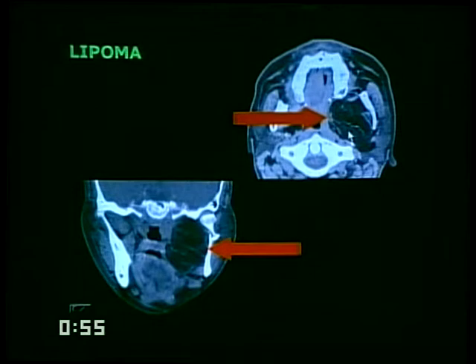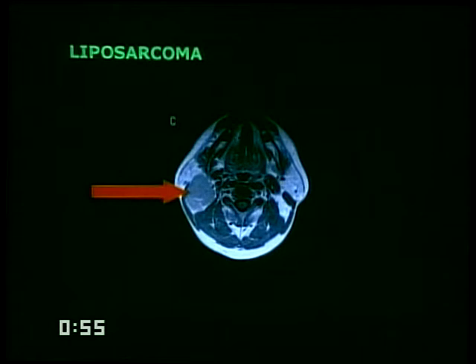This is a lipoma, fairly well defined, quite a rare tumor, but you do see lipomas in this location. Usually asymptomatic, but can be a palpable finding in some children. Liposarcomas are very different from lipomas. They originate from the same lipid progenitor cell, but they do not have macroscopic fat. As Dr. Mitchell's already alluded to, if you see fat, it's a good thing. If you don't see fat, you've got to worry about bad things like a liposarcoma.